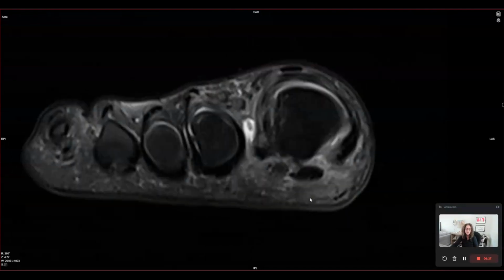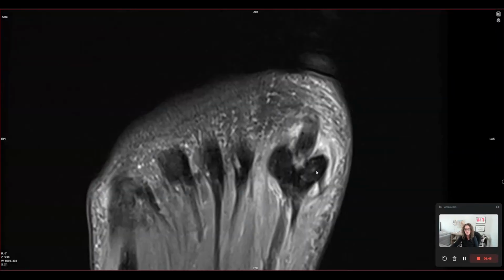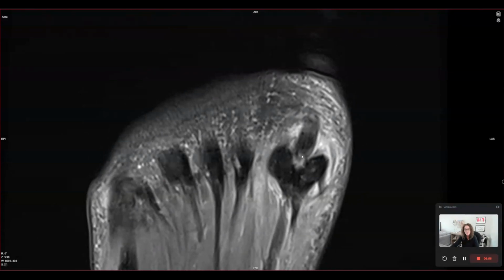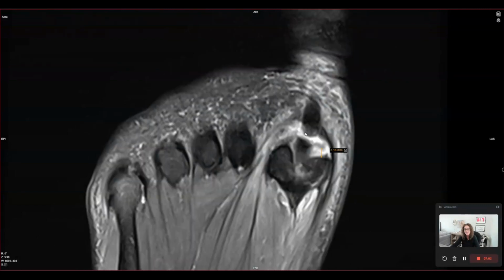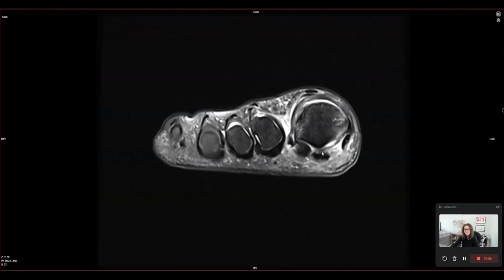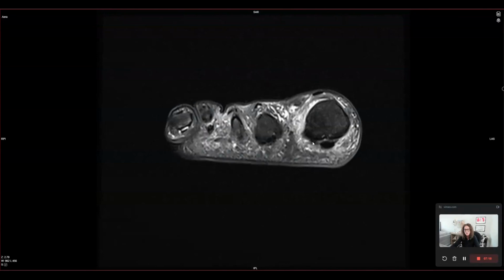To wrap it all up and just to make sure we've hit all the images, what I didn't mention was the actual plate itself. So looking at the metatarsal, if we remove the metatarsal head and we look down deep into the complex, the region that lives in this location is your plantar plate proper. And on either side, you can see that the sesamoidal phalangeal ligaments are torn, and indeed what's in the middle of that, even though we're volume averaging on this slice with the flexor hallucis tendon, when you look at that under a transaxial view, after you see the flexor hallucis, you're looking at pieces of the actual plantar plate that are torn in this patient.